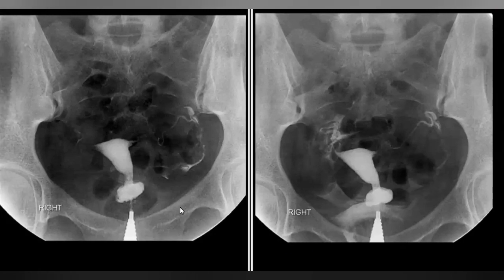On hysterosalpingogram examination, the uterus shows an outpouching in the region of the cervix. This patient had a history of C-section, and this type of appearance or outpouching in the region of cervix is due to the scar of the C-section. So if you find this type of outpouching in the region of the cervix, always think of contrast extending into the cesarean section scar, and the tubes are patent as you all can see.